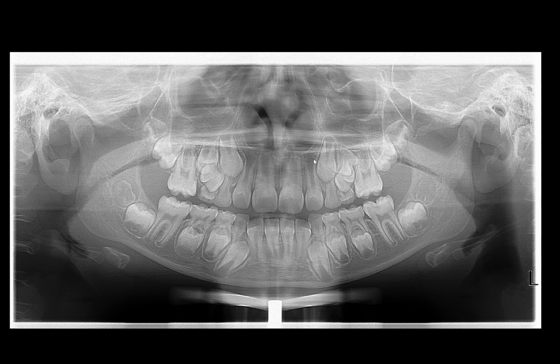If you look at this side, it's not as clear when you look at it for the first time. Here we have the canine. There is one of the two premolars, so then the question is, where is the other premolar? It can be a little bit confusing, but if we follow the outline of the root and the crown very well, you can see that the premolar is tipped distally, such that this is the coronal portion of the tooth, and here's the root of that tooth.